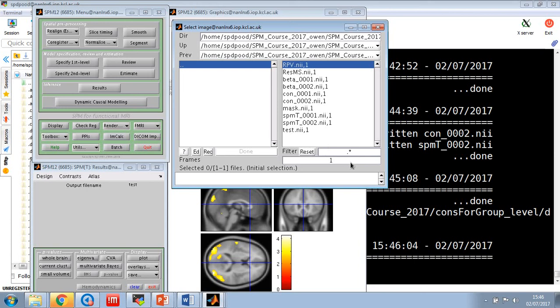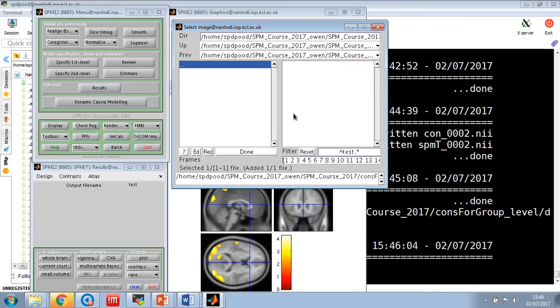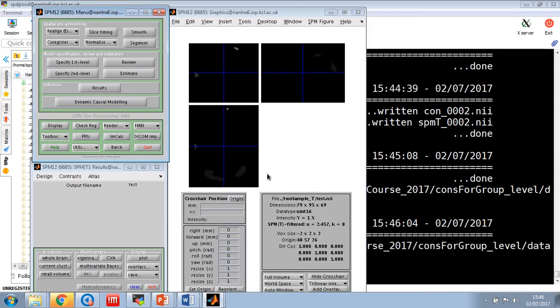So I've done this variable test, but if I now say little hat test, and I see how many, I'll say 1:1000 because I don't know how many there are. Oh, maybe there's only one.